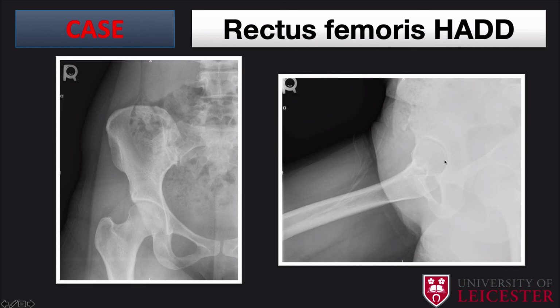Again, another example here, we've got adjacent to the anterior inferior iliac spine. You look at the AP projection, not really much going on. We have a look at the second view, and you have this very, very subtle focus of homogenously dense calcification just present. And therefore, don't mistake these for any avulsion injuries or heterotopic ossification. Just think this is likely calcific rather than ossification.